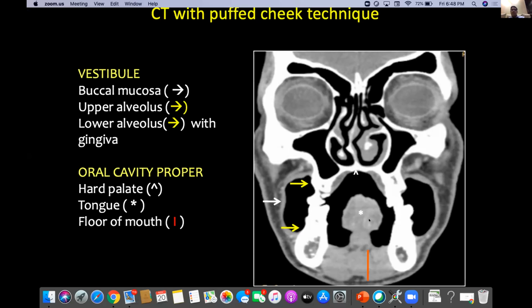For the tongue proper, you need MR, as I said, and I was talking about the dentulous and edentulous socket. I've seen over the years that we overlook the dentition of the patient, and it is very important to be reported in the scan, especially at the level of the tumor. You must report whether the socket is edentulous or dentulous at the level of the tumor, because if the socket is edentulous, there is atrophy of the mandible at that level, and the mandible is already smaller in size. The bones have atrophied in that area, so it indirectly acts as a free way for the tumor to enter the mandible.